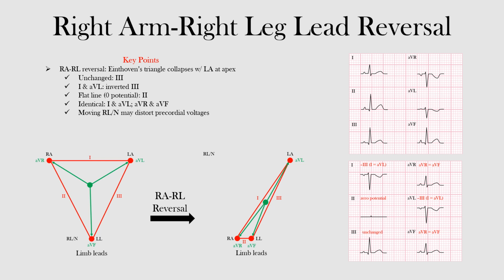Remember, the goal here is to be able to see why these EKG changes occur and then be able to reason them out on your own instead of memorizing anything. We'll also mention a few things that help to identify this type of lead reversal.